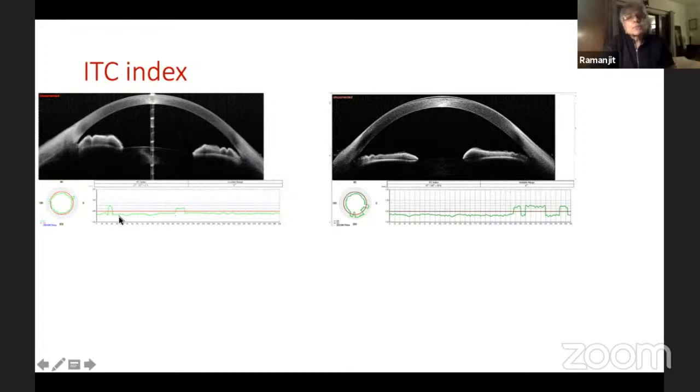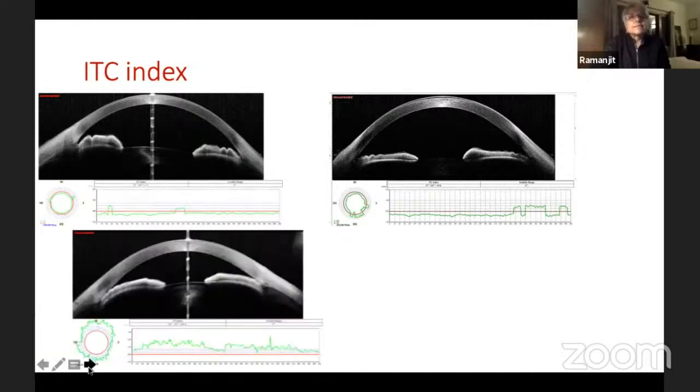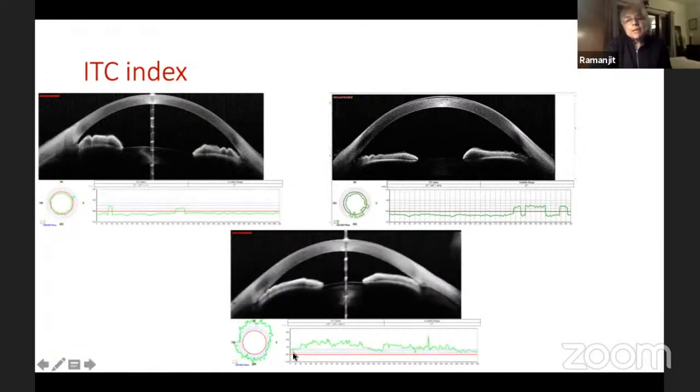And this is a patient with primary angle closure, and you can see there's just a little bit of the iris which is actually touching the trabecular meshwork in both eyes. All right. And this is with the patient in the dark, and this is with the patient in light, and you can see the difference that there is. This is a patient with primary angle closure glaucoma, and you can see again, please, if you look at the iris touching the cornea, you can see the associated sclerosis, fibrosis that is in the angle and in the cornea and the trabecular meshwork as well.